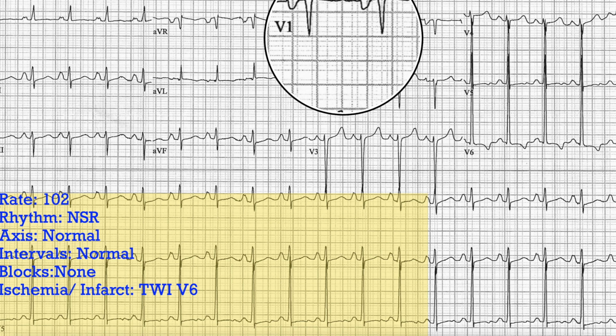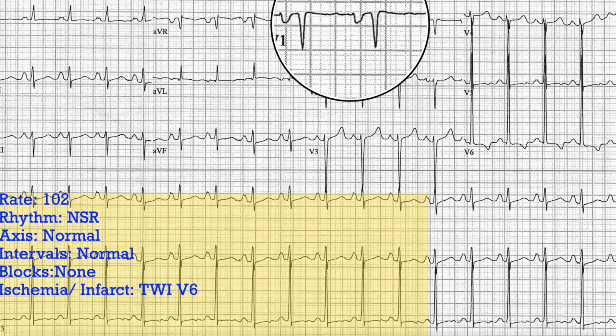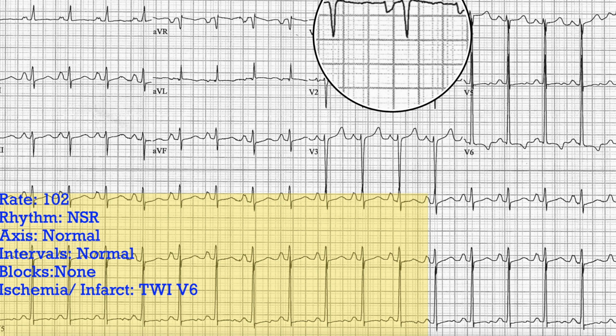Likewise, if we look at V1, where we normally look for the left atrium, if you remember the criteria for what left atrial enlargement looks like, it is usually a big negative P wave, or it can be a biphasic P wave, usually not the little upright thing that we're used to seeing. So either a predominantly negative big P wave or a biphasic P wave suggests left atrial enlargement. And again, that would make sense. You have blood backing up from a poorly relaxing ventricle, and so it backs up and fills up the atria, and the atria get big.